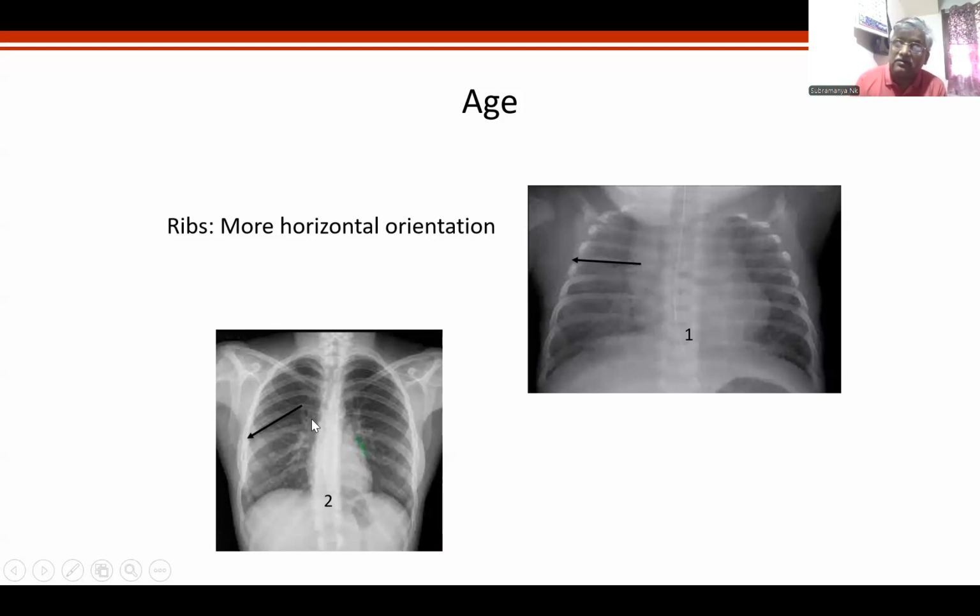Why this is important is because whenever you have a pneumonia patch or nodules in these areas, they apparently or falsely appear more radio-dense. I recollect many of the pediatricians will show a small shadow. Sir, here some patch is there. Remember, please look at this factor. Is it because of crossing, overlapping, false amplification of the radio-opacity? This is very, very important for all of us.